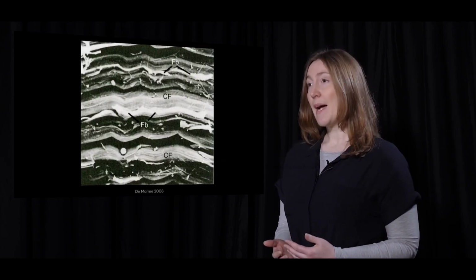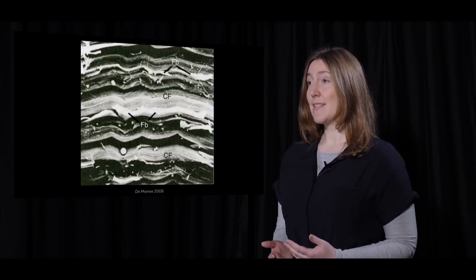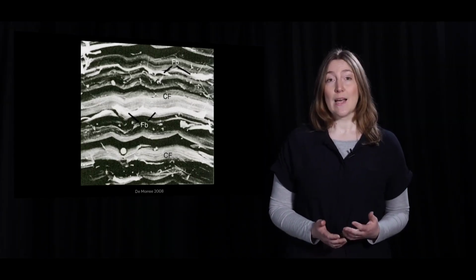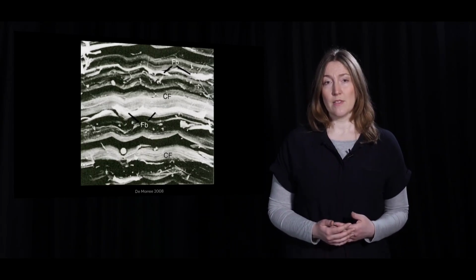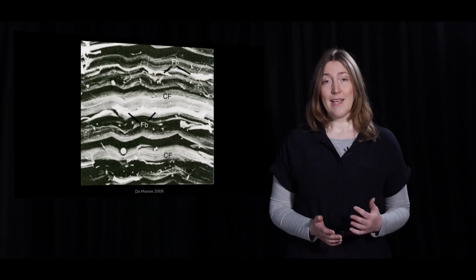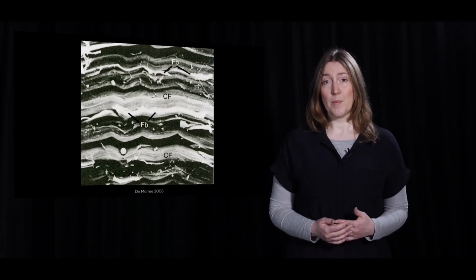This image shows how magnified tendon tissue looks in a relaxed state. Do you see the wavy appearance of the tendon? This wavy appearance allows the tendon to stretch during movements. But on micro level, you see that due to the curved fibres, it's hard to scan a relaxed tendon fully perpendicular.